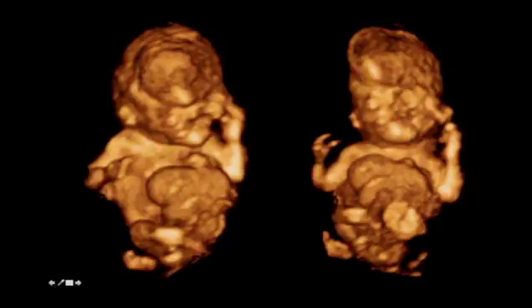And this is a destructive cleft. This is a cleft which is really not anatomic. It really couldn't develop embryologically like this. This is more of a destruction of something that was already forming, which is the hallmark of amniotic bands.